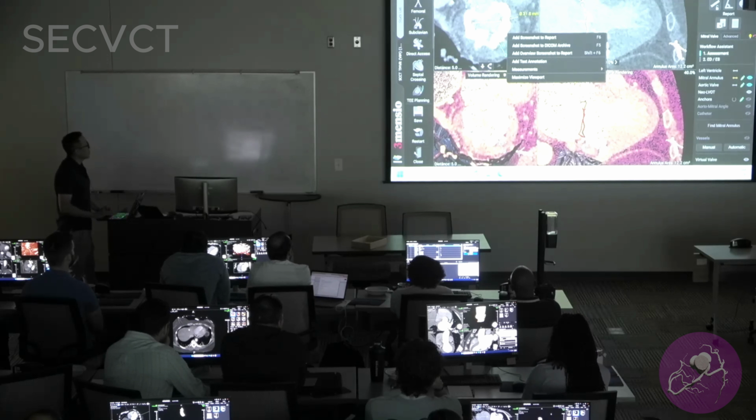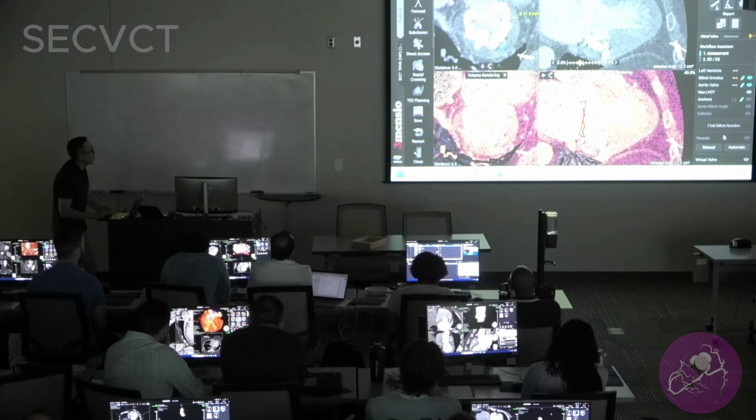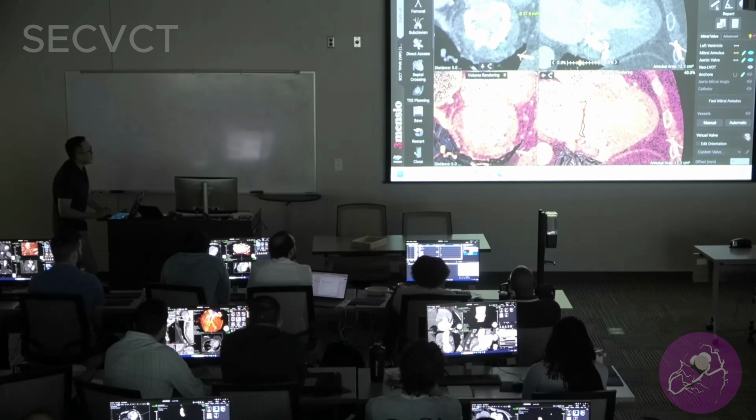And so this is measuring, click out of this, 31.8 millimeters. So the largest SAPIEN TAVR valve is 29 millimeters, and if you pump it up, you can maybe get it to 30 millimeters. And this is another one of the challenges with these valve and MAC cases. If I put a valve in there, it ain't going to fit perfectly, right?